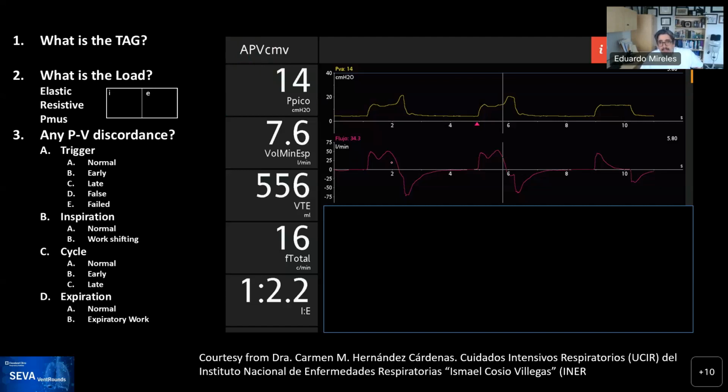In this case, the pressure is being controlled, and we know that because if we look at the flow, each one of them was different. And actually, you can see here a breath in which the pressure seems to be controlled and it decays exponentially. I see everybody's putting in, and they recognize that this was a pressure control breath, so we'll put it there.